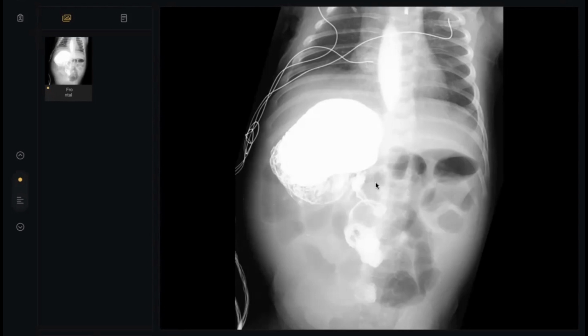Yes. So from the beginning, it is better to talk about it. See, this is the stomach. Suppose this is the duodenum, okay? This is the duodenojejunal junction. Even the jejunum shouldn't be seen here. It should be seen here, okay? What is the sign of volvulus?